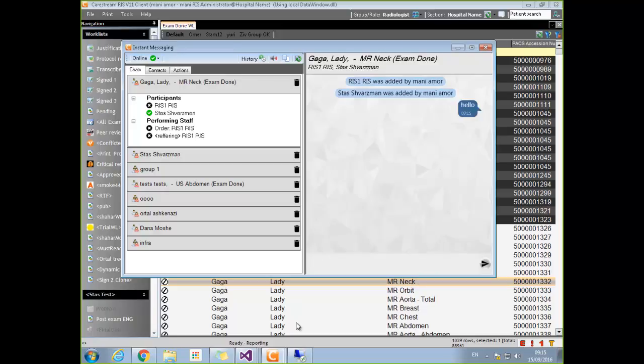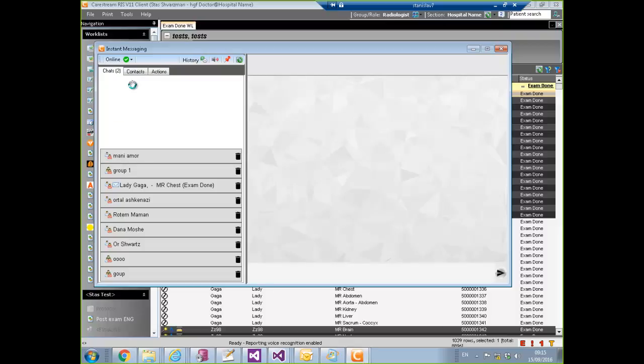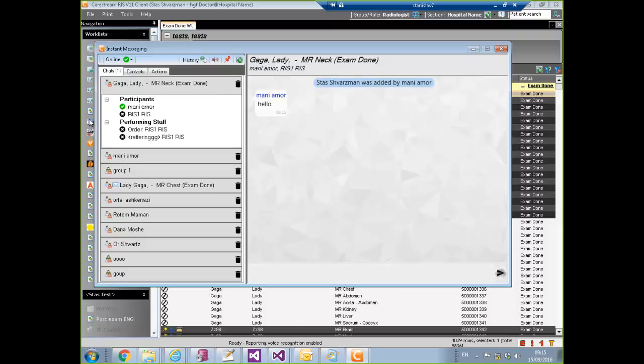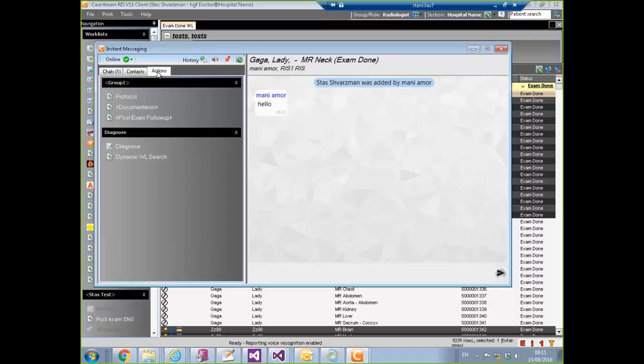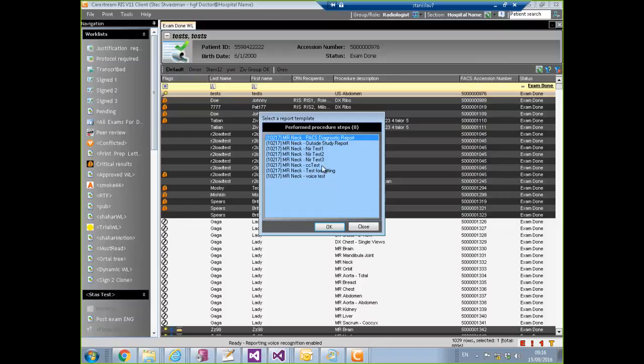Now he has this new chat. And if he wants to diagnose this study, we just press diagnose from here, and all the contacts.